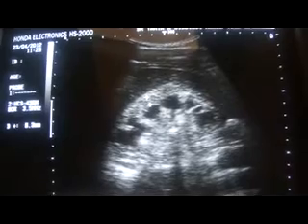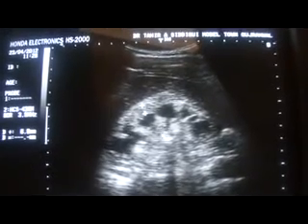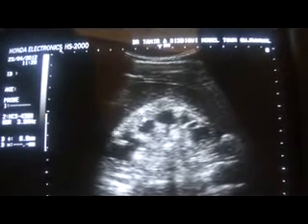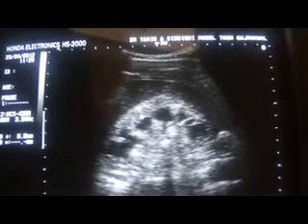Now the fifth thing to note is that there is no central sinus echo complex seen, because the stones lodge in this area of central sinus echo complex. If you see the normal kidney, this is the area of central sinus echo complex, which is not seen in this case. So these are the findings.